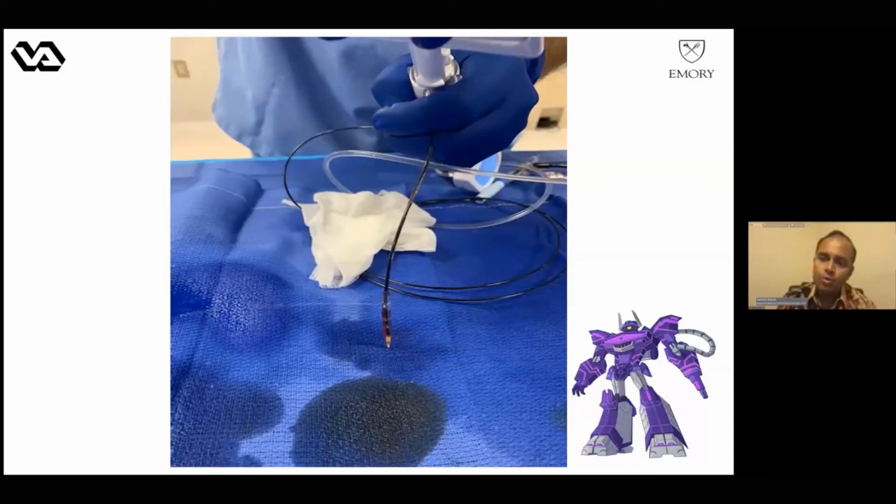And also the other thing is, at least for the United States purposes here, we are treating calcium behind the stent. So that is actually an off-label application as well, because the approval for shockwave is more for de novo, as those of us who use it are aware. So there's some flavors there.